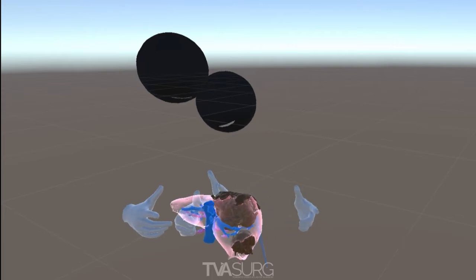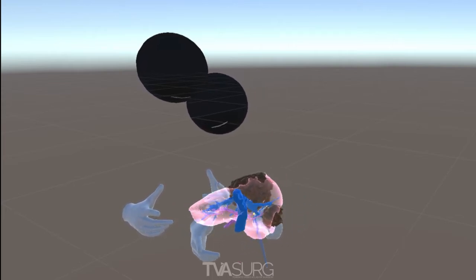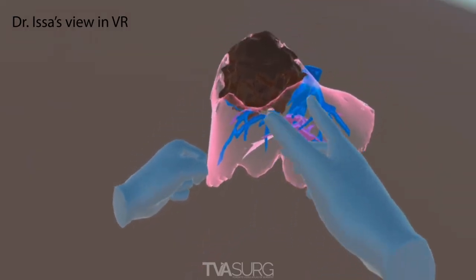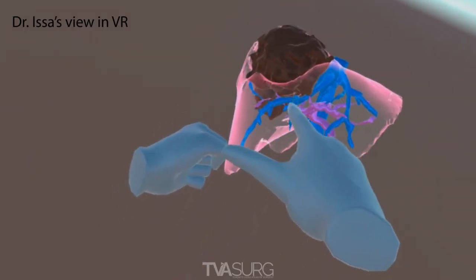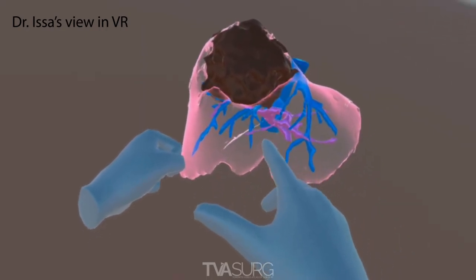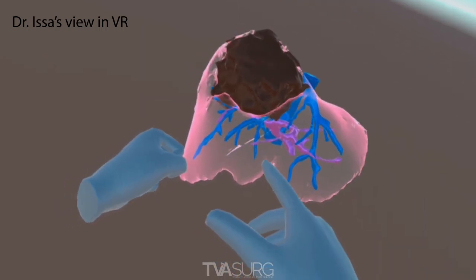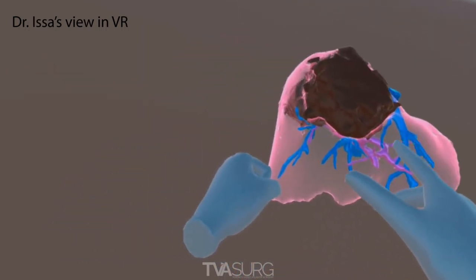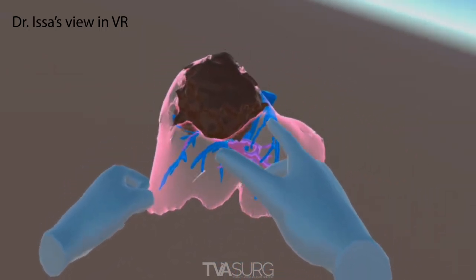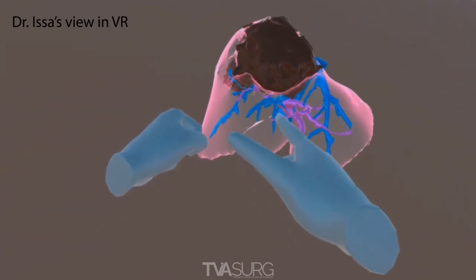So if you look at this, what would you guess will be the transection that we will need to do for this patient? The middle hepatic vein is involved in the tumor, so that's going to come in our resection, whereas we're going to preserve the left. So I would think you would have done an extended right hemihepatectomy. Exactly, taking the middle, right?